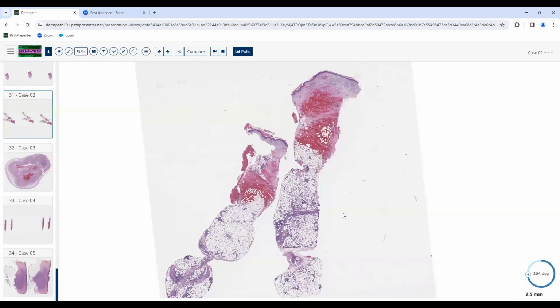Looking here, there's a punch biopsy, and it includes epidermis, dermis, and subcutaneous fat. In the dermis, I can't exactly tell what's going on. It's a lot more red in color, almost like it could be extravasated erythrocytes, maybe. Yeah, one pearl is if you see a biopsy that looks like a lake of red cells in it, it's probably artifactual, from the time of the biopsy. Oh, okay. So forget about that.